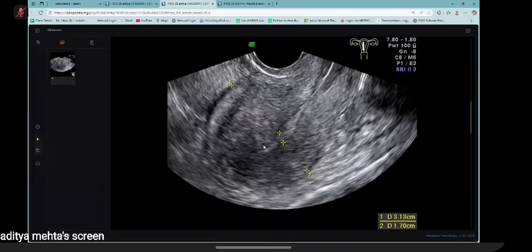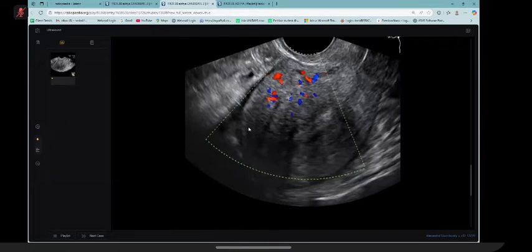Have you spoken that? I don't know whether I have missed it or not. I said heterogeneity is along the anterior myometrium. No, asymmetry, I mean the size, the thickness. The anterior wall is enlarged compared to the posterior wall. Otherwise, heterogeneity, you have spoken that, I know. Otherwise, everything was fine, and you managed it nicely. You sent it to the gynecology team. You also discussed regarding MRI. So, yeah, you picked up very well. You managed all the tick boxes nicely.